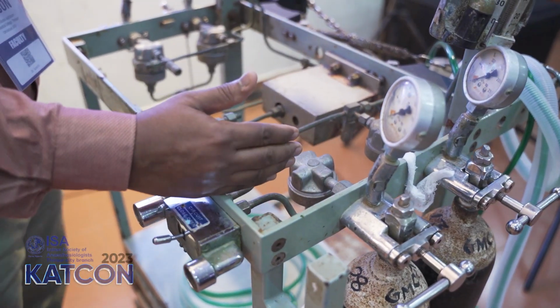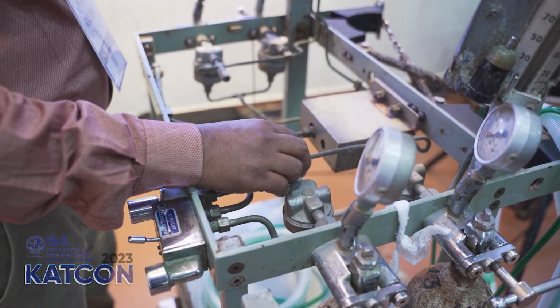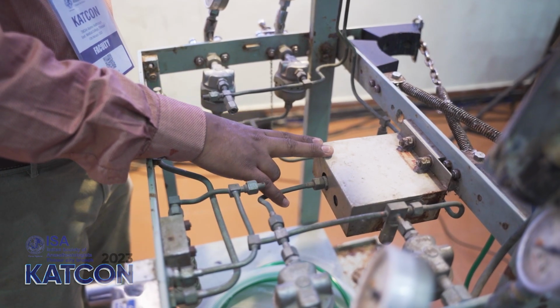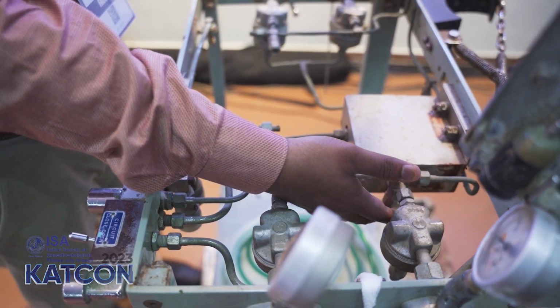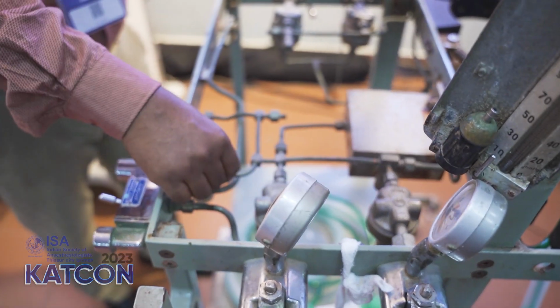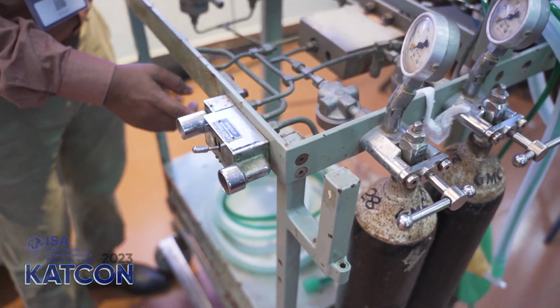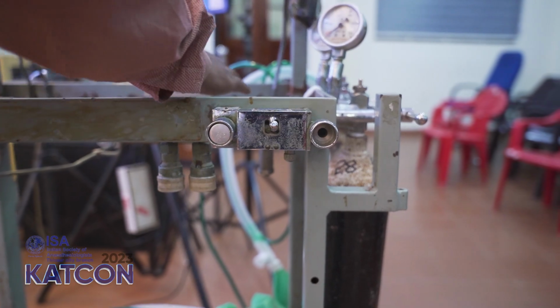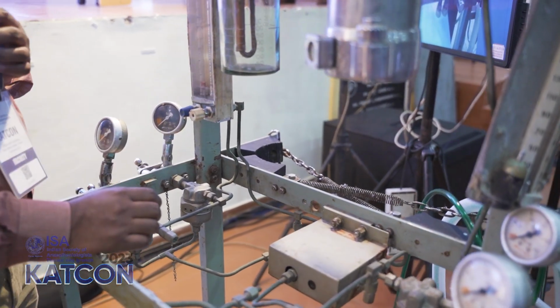Now coming to the intermediate pressure system. That includes the piping connecting from the pressure regulators, extending to this oxygen failure alarm. It's an electrically operated oxygen failure alarm, and there is a pressure relief device for the intermediate pressure system, which can leak at times. Some of you may have seen that. In the intermediate pressure system also comes this oxygen flush and the Schrader quick coupler connections for ventilators or jet ventilators. Can you see this downside? This all comes under the intermediate pressure system. And then it extends till the flow control valve. So from the pressure regulator up to the flow control valve is the intermediate pressure system.